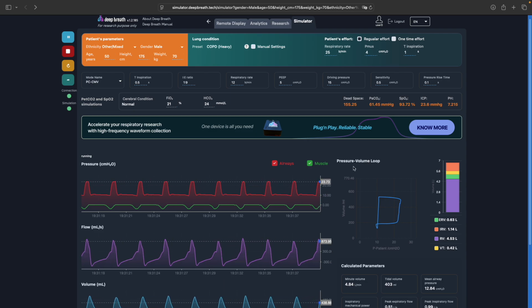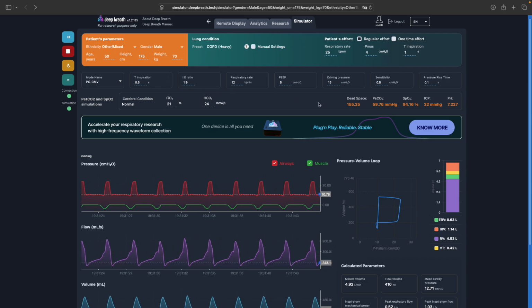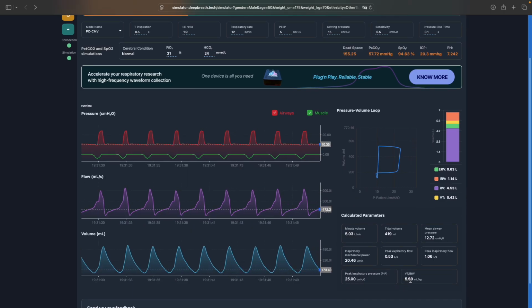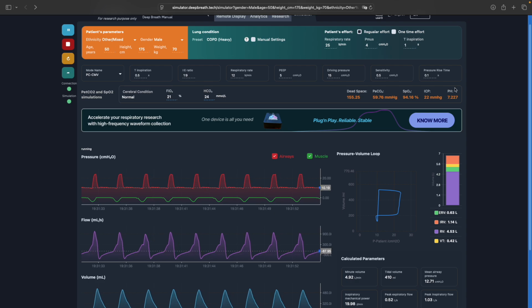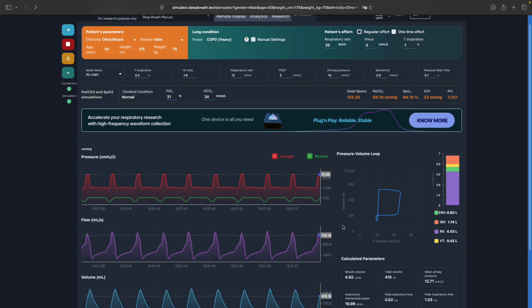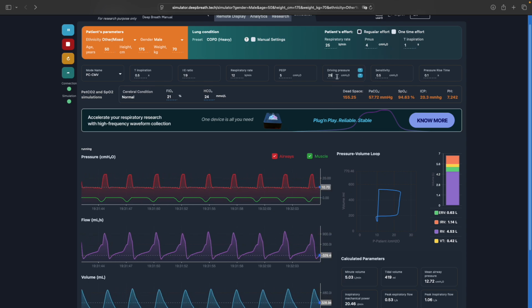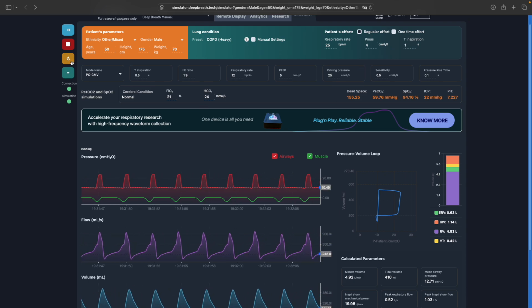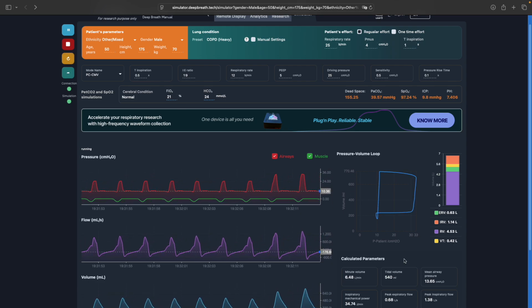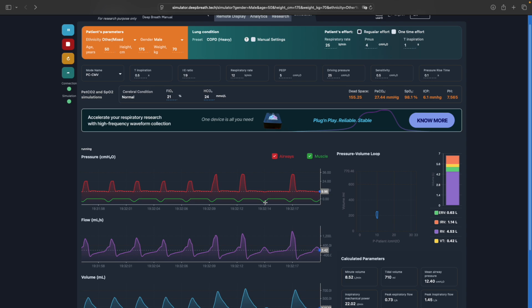So we see the patient in pressure control mode of ventilation. We see that it's not enough ventilation, so it's quite low tidal volume, minute ventilation, and not enough pH level. It's a simulation, but it's quite accurate. Assume we want to increase driving pressure, and let's say we want to make it 25 to increase tidal volume. And now something unexpected will happen. So obviously we increase tidal volume, but we get failed triggering cycles.